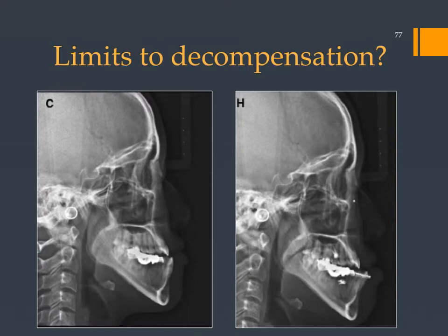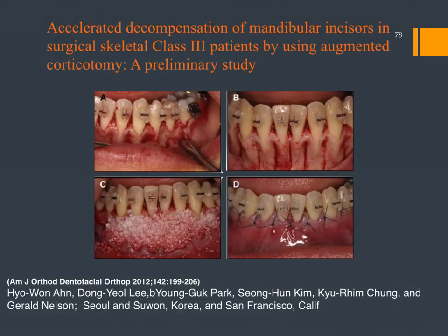And you can see the amount of decompensation in this patient that one does, and you can also see that the symphysis is pretty thin, and there may not be much bone around those teeth.